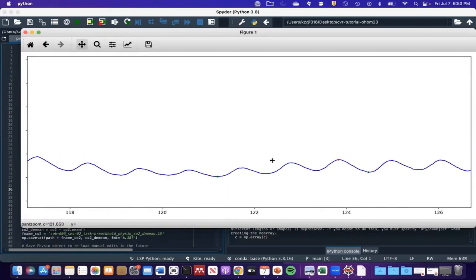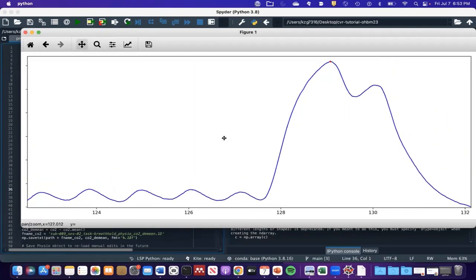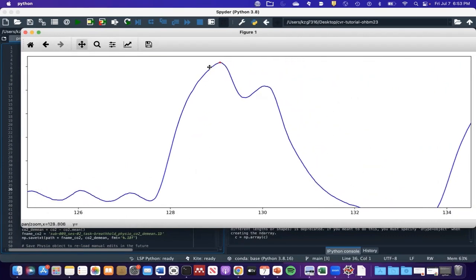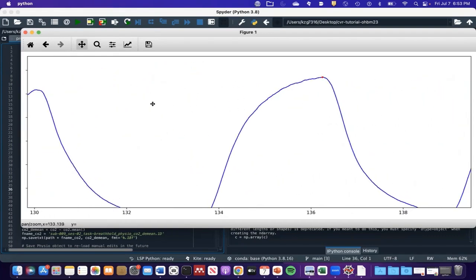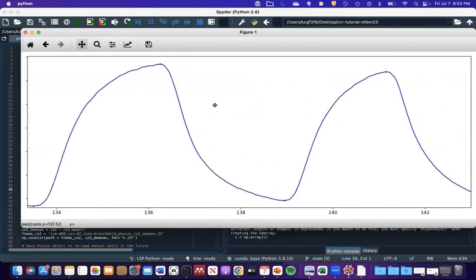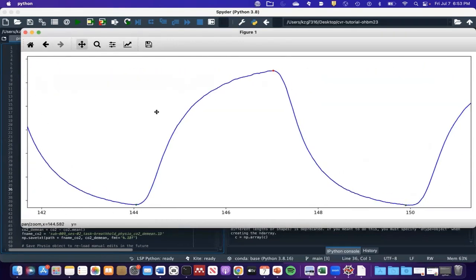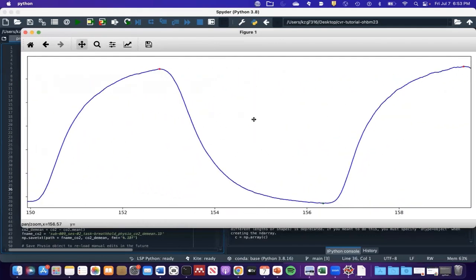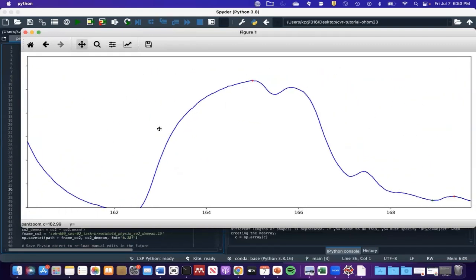And this is a pretty ideal CO2 trace right here. It's pretty easy to tell where the end tidal peaks are, and they've done the breath hold very well, and also performed the exhale at the end of the breath hold, which is what we need in order to get those estimates of end tidal CO2 at the end. And that is where some participants struggle specifically. They either forget to do this exhale or don't do it with the right pressure, so it's not recorded with the nasal cannula.